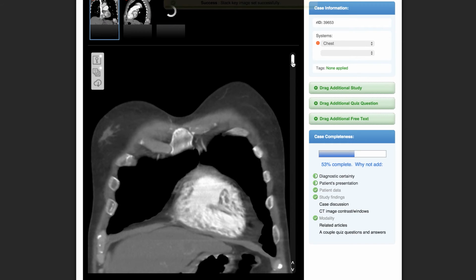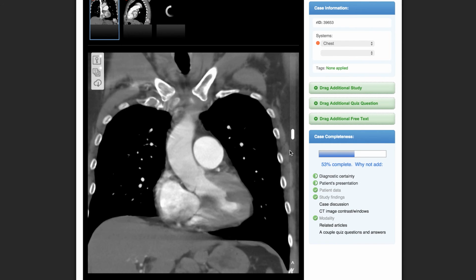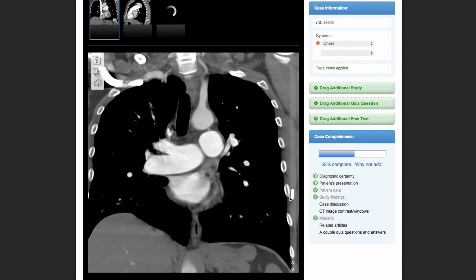This is the image that best represents the whole case. It will be used as a thumbnail. Be sure to do this yourself, or the middle image in the stack will be selected by default. After selecting the key, the thumbnail for the series will be updated to reflect your choice. Again, select the projection below.